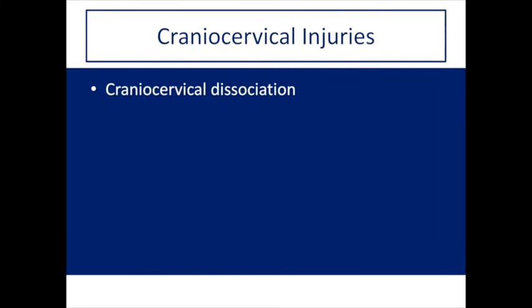We discussed some important measurements at the craniocervical junction that will help clue you in to more subtle craniocervical dissociation. If I stress one thing in this lecture, again, as I mentioned earlier, it is to never miss subtle craniocervical dissociation. We will stress this and show examples of craniocervical dissociation when we look at real cases later.